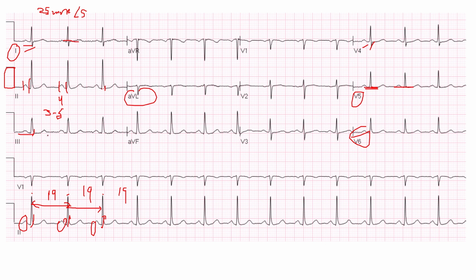Okay, now let's go to the inferior leads, lead 2. For example, we might see some sort of elevation, but it's not even more than 0.5. So it's not counted. It's almost not elevation, by the way. It's totally normal because you have to take this one. So it's normal. And to check even more, let's take lead 3, because leads 2, 3, AVF look at the inferior side. Lead 3, normal. Lead AVF, normal. So it means it's normal.